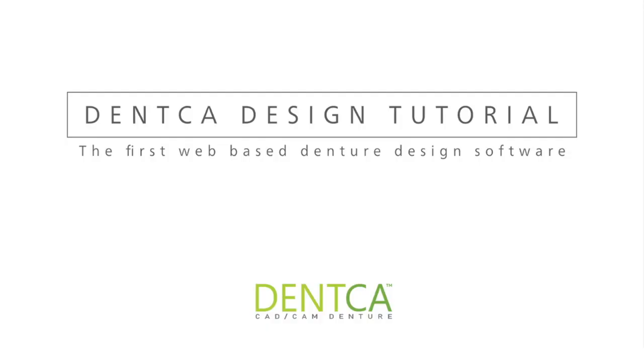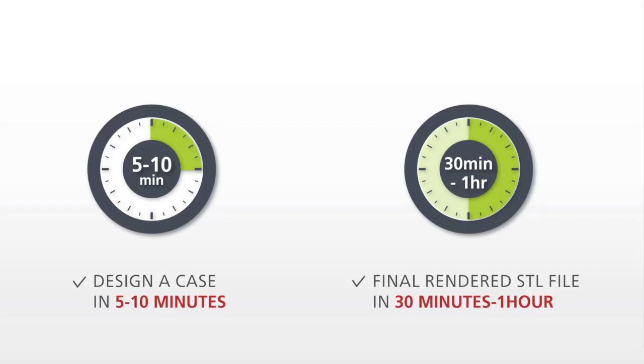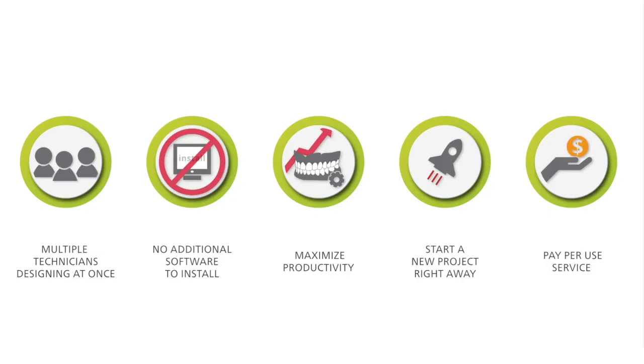Welcome to Dentca Design, the first web-based denture design software. In this video, you will learn how to design a digital denture using the Dentca Design software, as well as an in-depth explanation of all the special functions added to better customize your cases. You will be able to design a case in 5 to 10 minutes and have the final STL file rendered in 30 minutes to an hour.